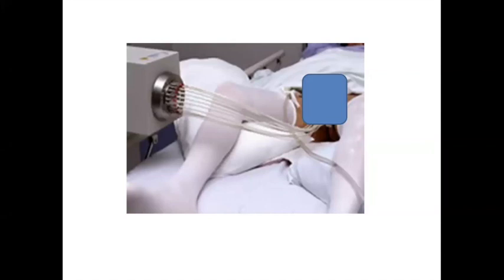So I draw on the area that needs treatment, and I draw on the urethra and the rectum to say that doesn't need treatment, thanks very much. And then the physics team come up with a plan about where the radioactive source needs to loiter in the prostate, in those plastic tubes, and for how long.